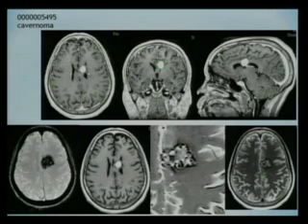But this is what it looks like on the T1-weighted sequence. On the SWAN, the susceptibility sequence, it blooms. That's why the SWAN is so helpful to find old hemorrhages. And then when you magnify it, it does look like a mulberry.